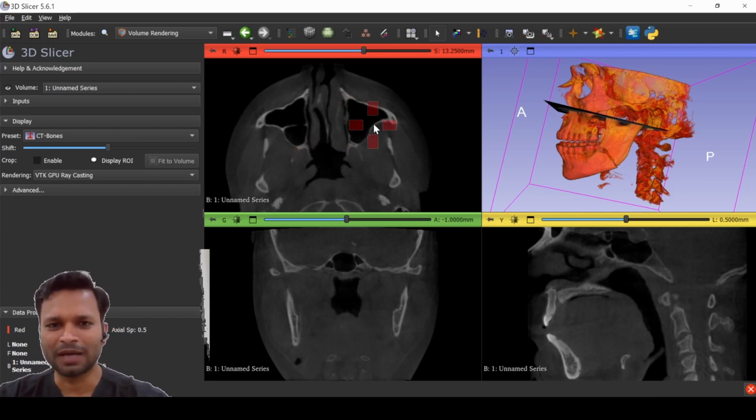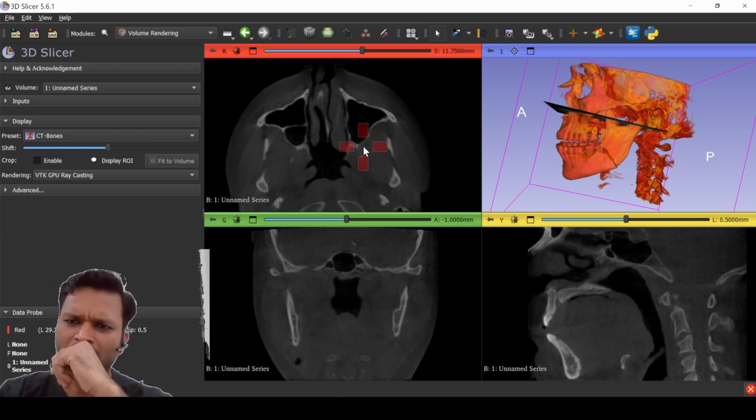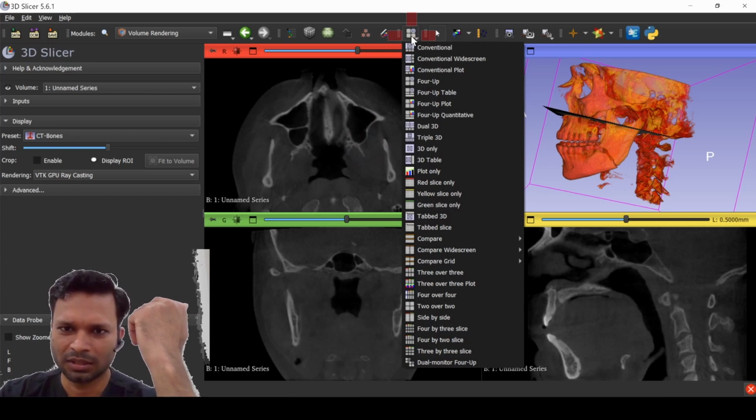So at this point we have the maxillary sinuses in the slices, but you also see these two islands of bone. These are the coronoid process and condyle head. Okay, and in between there is a gap because we have the sigmoid notch here. Okay. Again, as we go further down, let me see if I can change this.